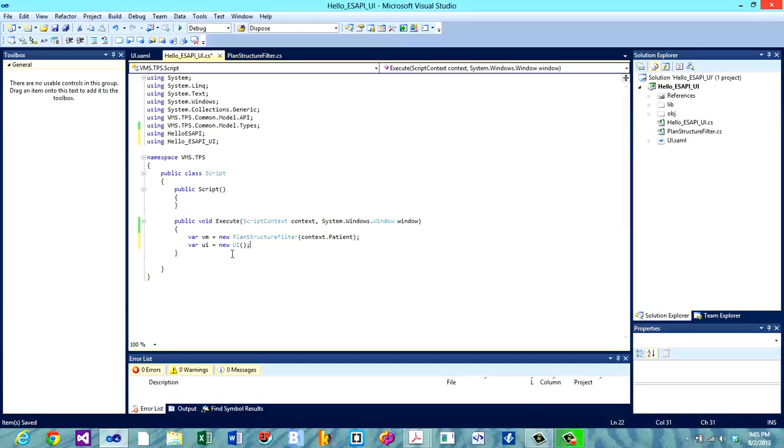That's a XAML object, and it's behaving like a C# object. And that's what I wanted to point out here, is that XAML is, like I said, a way to represent .NET objects using an XML-like syntax. So this really is a C# class, if you will, that we've made typing it out in XAML, and this will still have properties of a user control, and that's how that works.